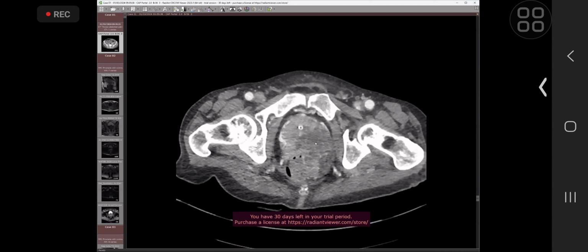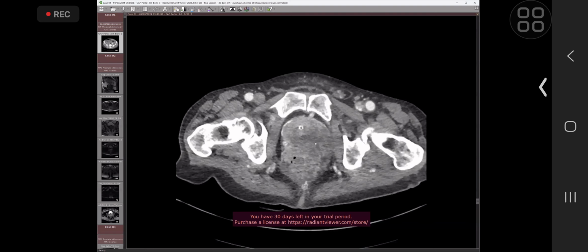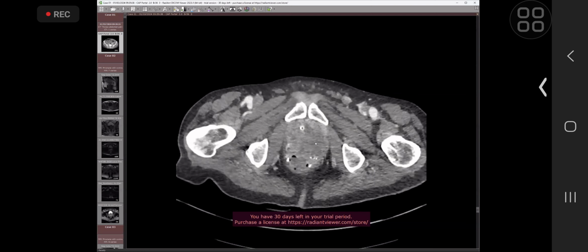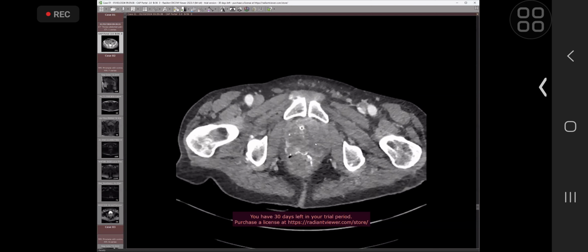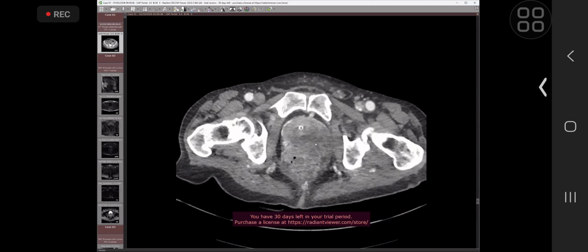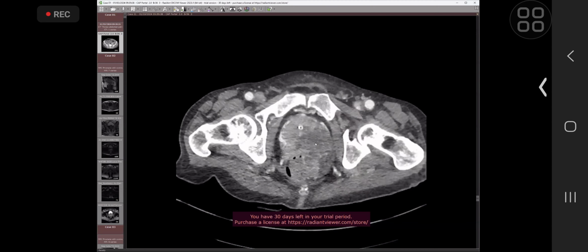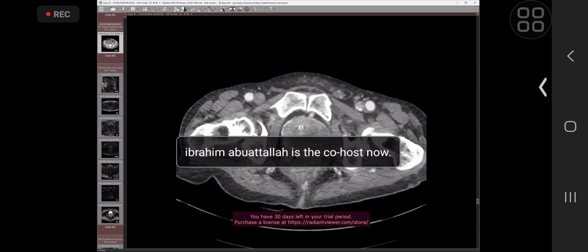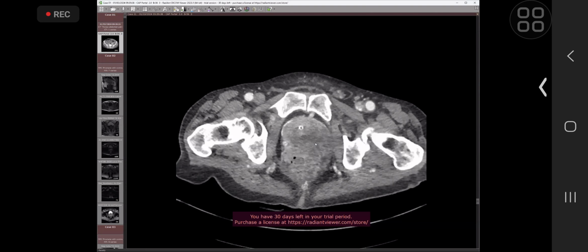It looks more centered on prostate than rectum. We do have a clue with the PSA being 71. You have another clue that the session's about prostate rather than rectum. That's a superficial clue that you won't get in the exams, unfortunately. But it could be one invading the other. And certainly if you had invasion of the prostate, that would be something that could push up your PSA. Perhaps not quite to that level, but that's circumstantial evidence.